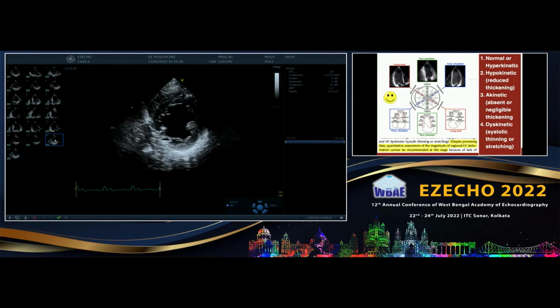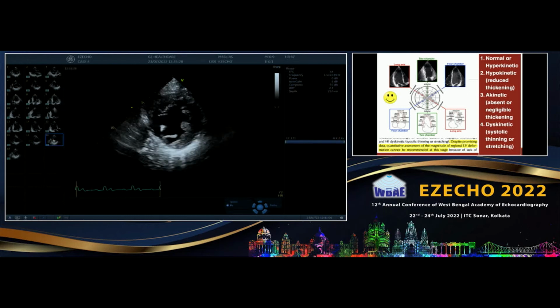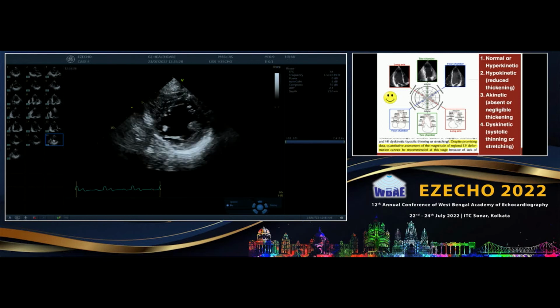What we are going for in segmental is only the color pattern, which we qualitatively look at on the bullseye, just to know the pathology. So you are doing only qualitative assessment. So don't believe the regional strain. The reproducibility is a matter of concern. Pattern recognition is the only important thing you can do in the regional strain, I think.